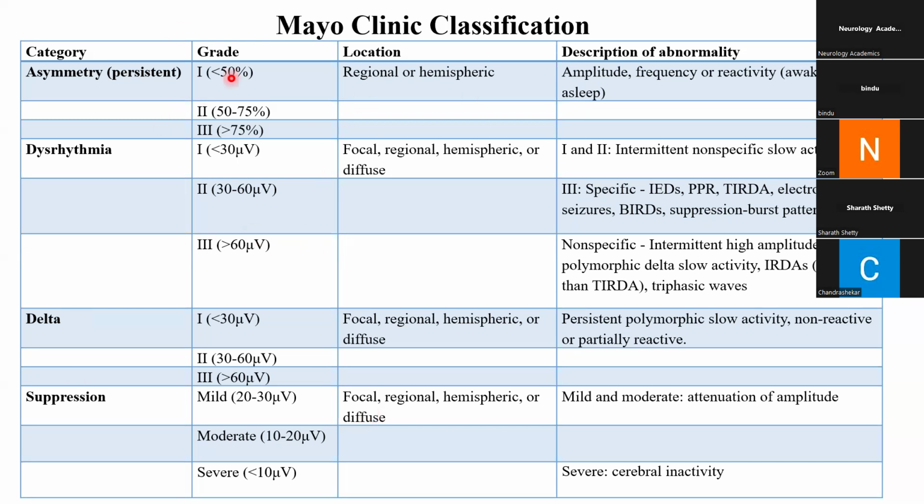And coming to asymmetry, just see to it that you qualify asymmetry only when a patient who has undergone a surgery or a trauma or a subdural evacuation comes into the picture, when you can say that the activity is increased over the surface, which is both the frequency and sometimes the amplitude. If you go into the breach itself, that is a 1 hour class, so we don't want to confuse anybody. And suppression, you can start from the bottom.